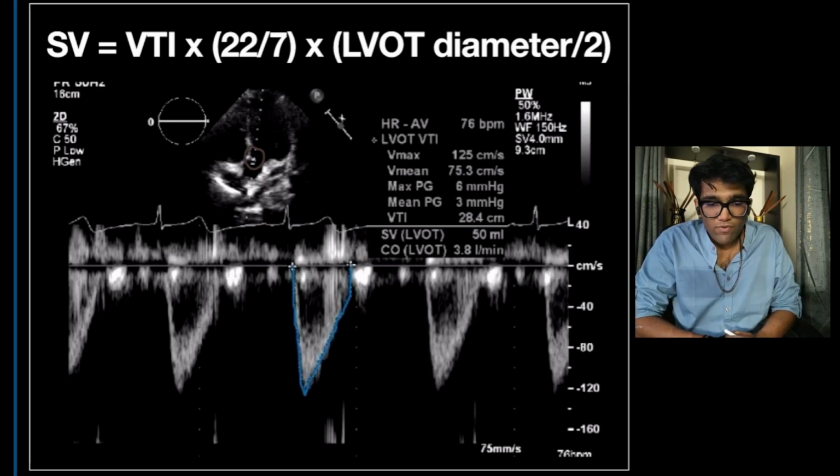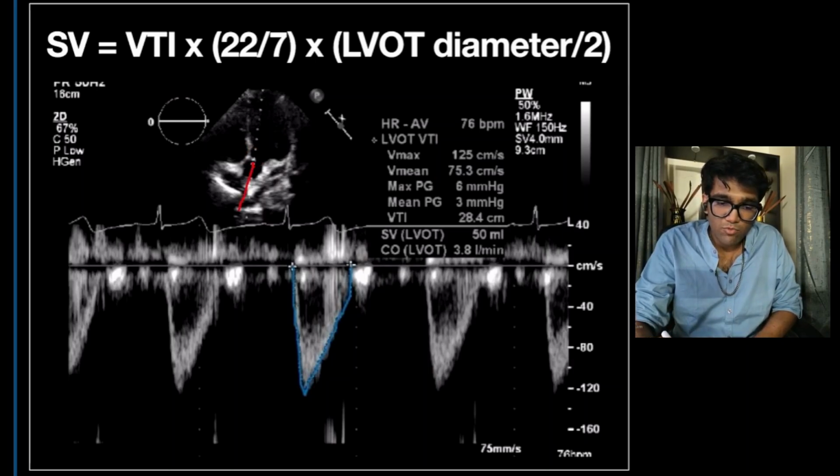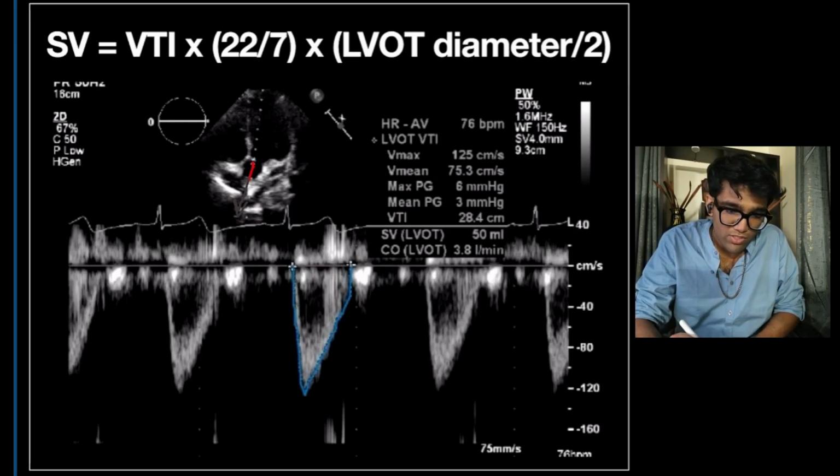So what we find is blood is during systole moving away from your probe. Your probe is here and the blood is moving away. So systolic velocities will be represented as negative velocities. So this represents your systole. What we do is we trace the silhouette of this curve. Each line here represents the velocity at a given time t.